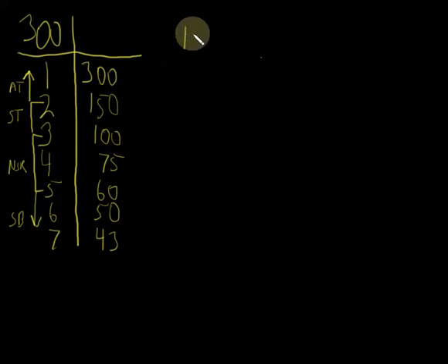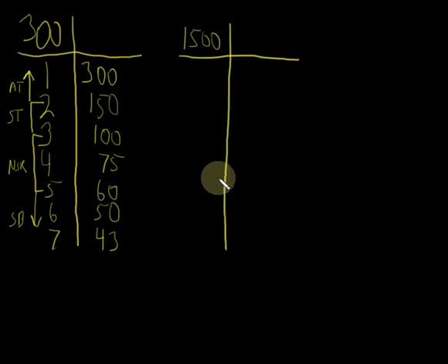So if I have a heart rate of 1500 beats, or I'm sorry, 300 large blocks go by every minute. Well, there's 5 small blocks per large block, so we have 1500 small blocks go by every minute. Well, now, logically, if it was every small block, it would be a ridiculously fast heart rate. This would not be consistent with human life. So a heart rate of 1500 just isn't going to cut it.